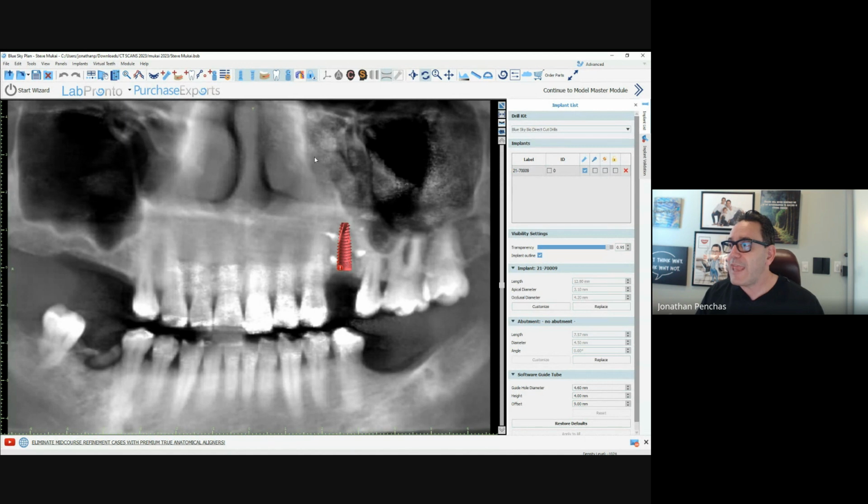If you see any sort of a problem in the sinuses, it's up to you to either refer or diagnose and treat the problems. You need to start understanding deviated septum and sinusitis. This patient here has sinusitis in his left sinus compared to the right, where you could see that it's pretty much a normal sinus.